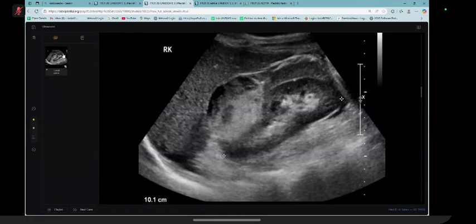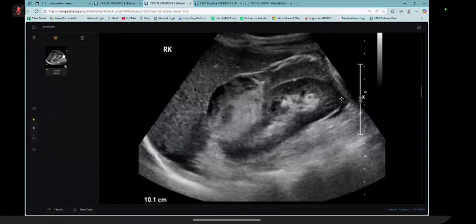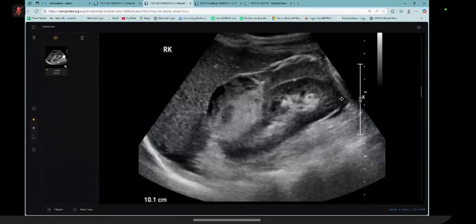I would like to know the history of this patient. This hyperechoic lesion also has a few areas of low density within. Sir, my topmost differential in this case will be an angiomyolipoma, which might be with an associated bleed. However, I would like to confirm this finding on CT, inform this finding to the referring physician and take the history related to the patient.